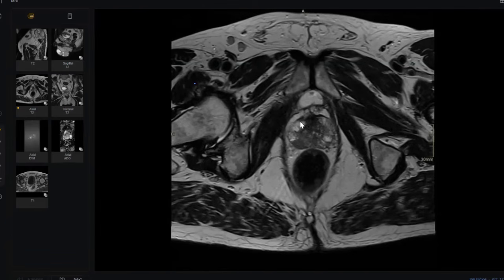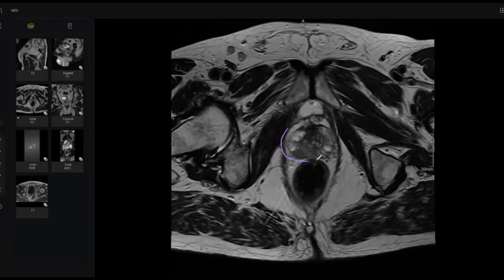What does it mean? Normally, in the prostate, this is the peripheral zone. Normally, it should be bright like this one in T2. Look here, there is a very dark area, and there is a big difference between here, my colleague, and the left side. Why? Despite the left side looking like it has some foci of low T2, it is ill-defined and heterogeneous. But look here, it is markedly dark on T2.